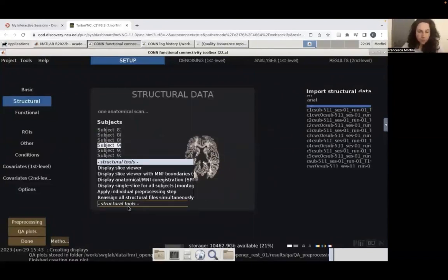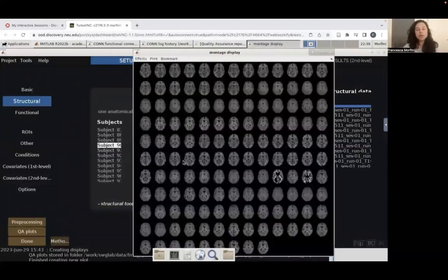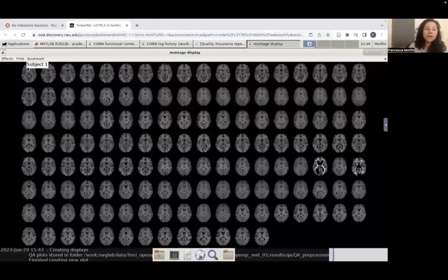One thing I wanted to highlight is that when something has gone wrong, there are various places where that information can pop up and be readily recognizable as something that stands out compared to the data set. In this case, if I look at the same slice for every subject, I can take a very quick but comprehensive look at the full data set we're working with.